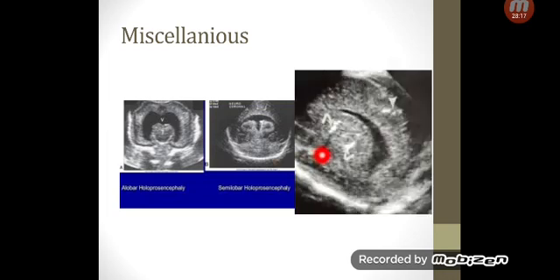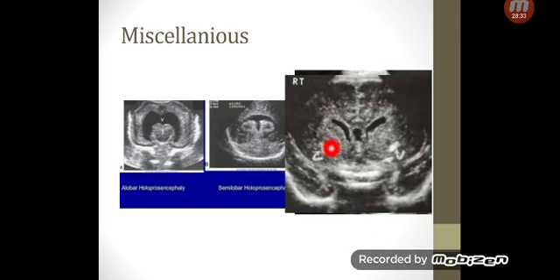What is this one showing? So this is really cool and really interesting to know that you can pick up via cranial ultrasound if you're paying attention. These are calcifications, periventricular calcifications, and here they are again. So what is that denoting, or what should you screen for when you find these happening like that?